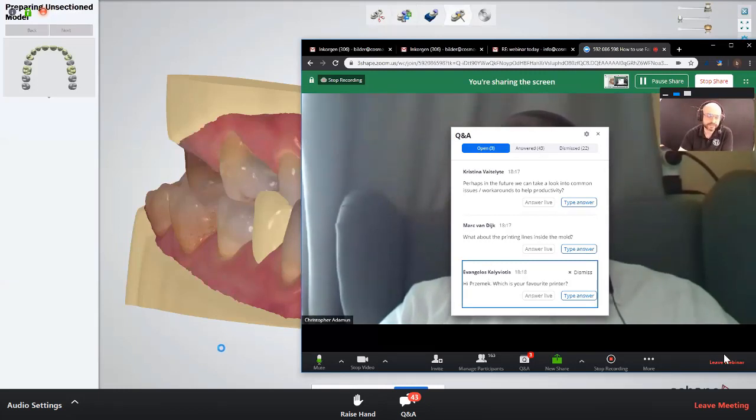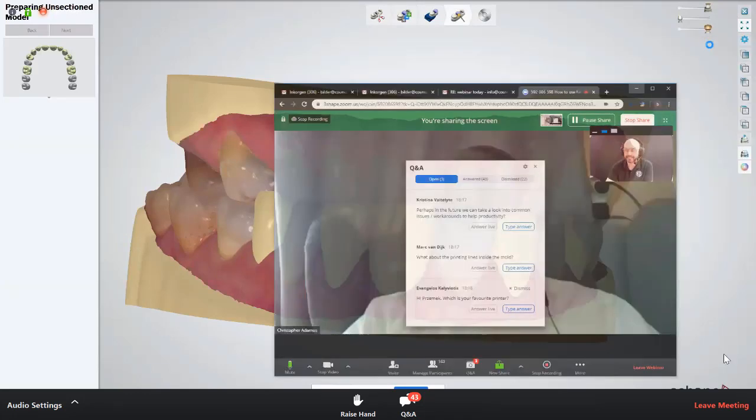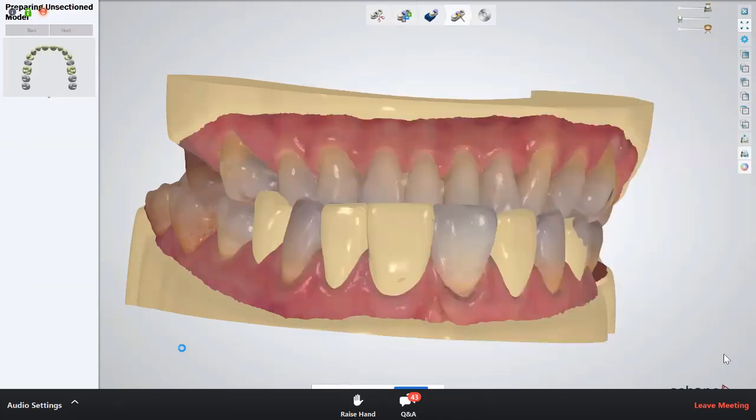Okay. So what kind of workarounds do you need? I mean, we're doing workarounds, actually not so much today as we did in the latest couple of years, because with both 19 and 20, the software has been so well developed that today it's quite straightforward.